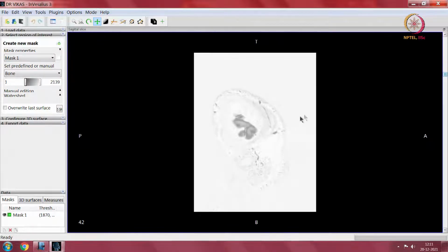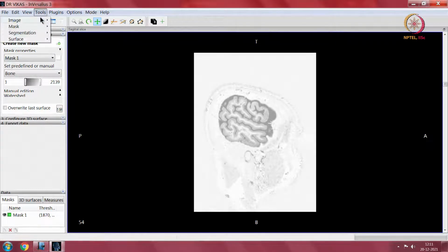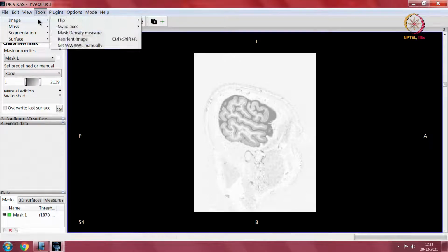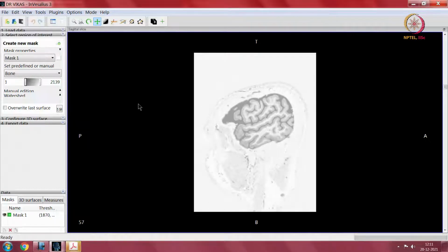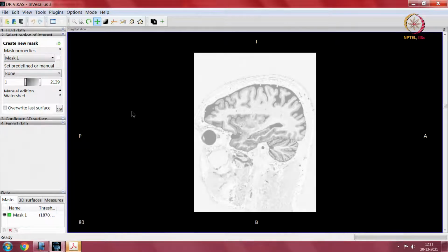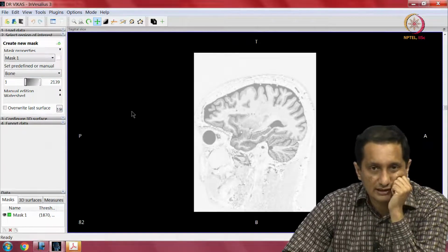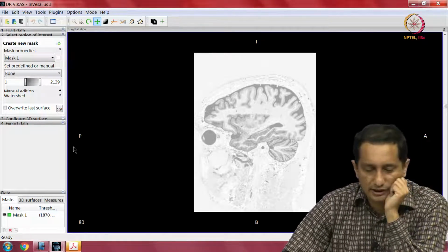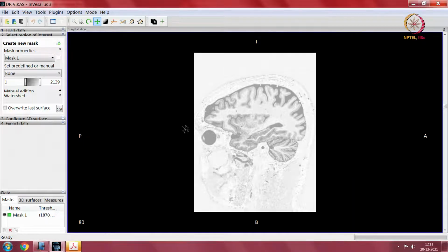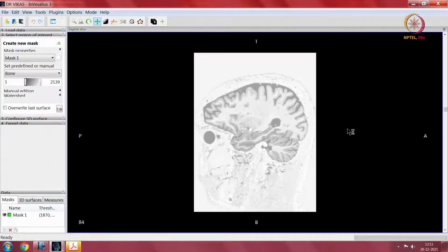So, we look at other parts of the anatomy, anterior, posterior. Generally, we would see it like this, flip. So, anterior, posterior, this is sagittal section. So, sagittal section is vertical across. So, this is an eye again. Please do not look at the nomenclature here, I have done a flip. So, this is the eye, then this is the back of the head, upper part of the head, lower part of the head.